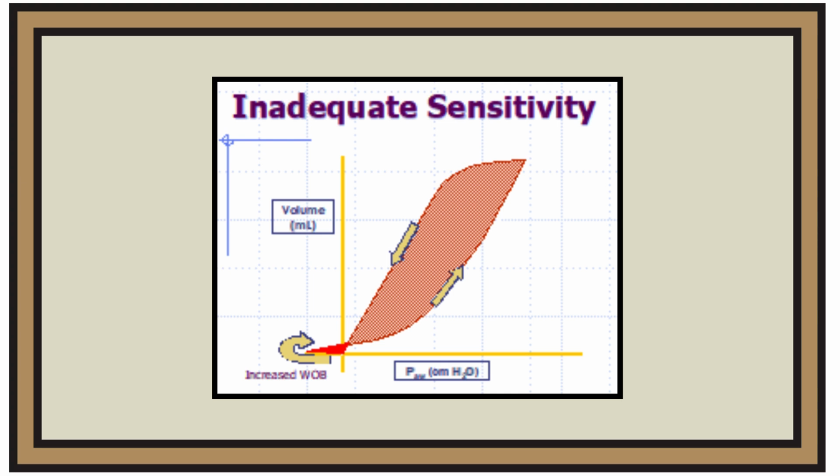Normally, the pressure volume loop traces in the counterclockwise direction. A clockwise tracing prior to the initiation of a mechanical breath indicates patient effort. Adjusting the sensitivity can minimize this effort. Inadequate sensitivity setting promotes increased work of breathing. On the pressure volume loop, as you see here, the sensitivity is shown very clearly.